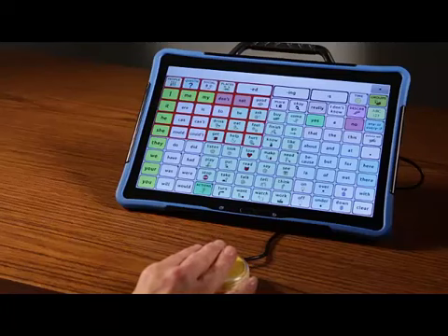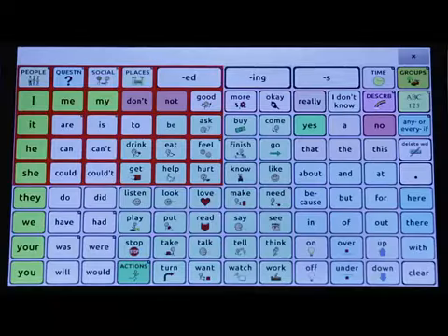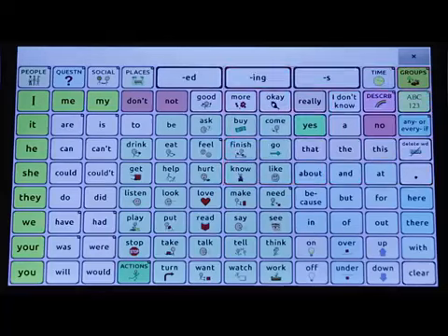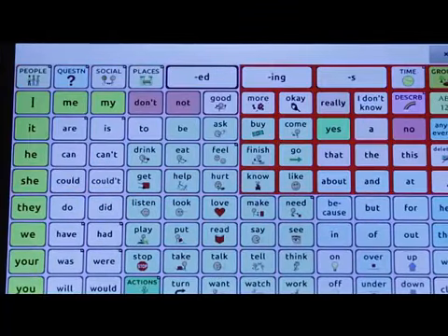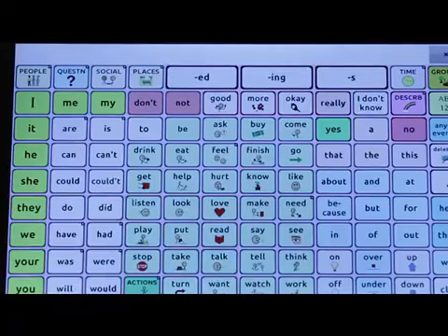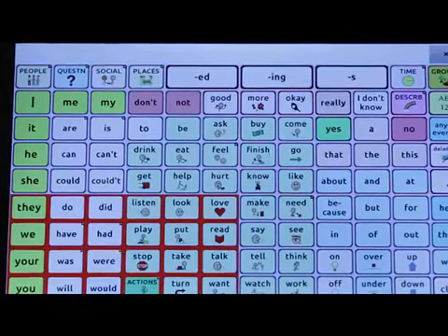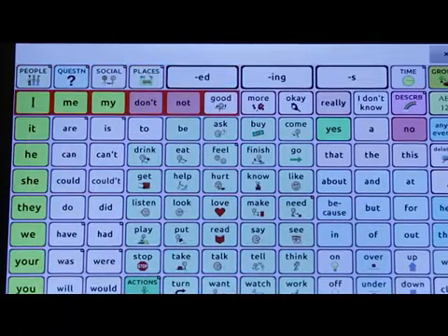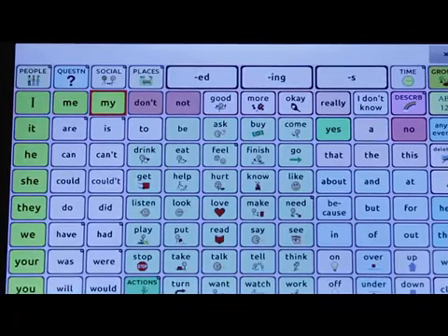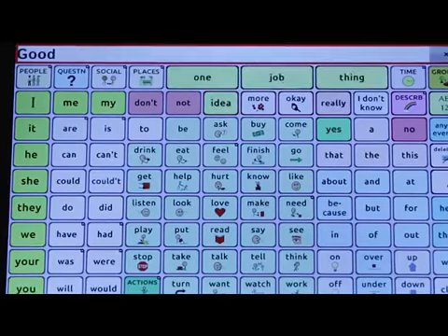Items in the grid are divided into blocks of buttons. They might be 3 by 4 or 6 by 5, or however you decide to arrange them. The blocks are indicated one at a time. When the block containing the desired item is highlighted, the user presses a switch. Typically, the indicator, or the highlight, then moves through the block with a row column pattern, button by button, until they get to the desired item, and the user hits the switch to select at each level.